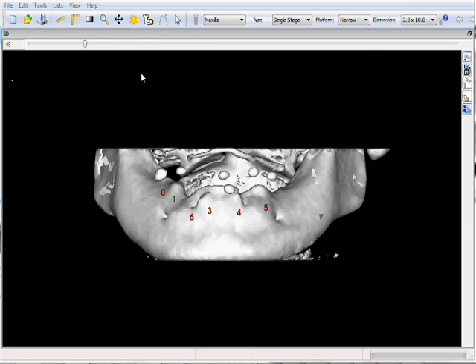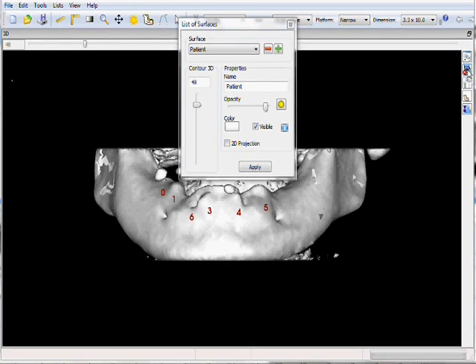Whenever we are about to edit the image, we first recommend to go ahead and make a copy of that particular surface. We do that by clicking on our surface list, selecting the surface which we would like to copy and edit, and clicking the green plus. We can now give the new surface an appropriate name, choose Apply, choose Visible to turn it on, and confirm that there are no other surfaces which are currently visible other than the one which is desired.